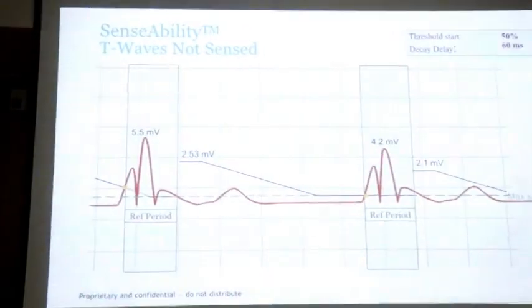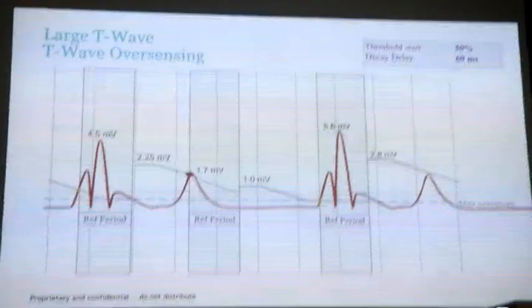And I'll show you some nice cases where the balance between making a T-wave disappear but seeing VF gets a little bit interesting, and we'll see how that presents. So we have all these numbers here. We don't need to worry too much about them. Here we've got no T-wave oversensing. Clearly, we've walked already through this, the refractory period and so on.